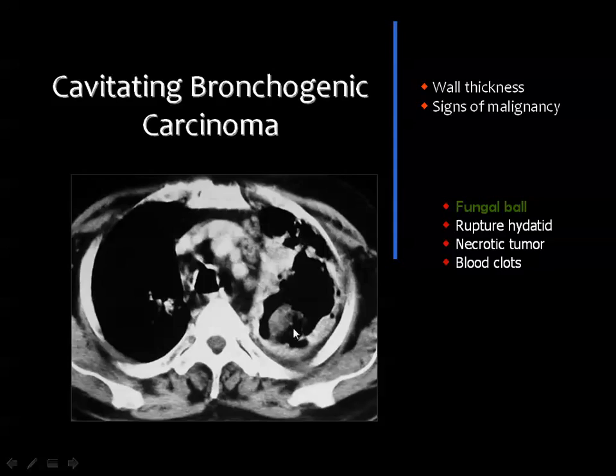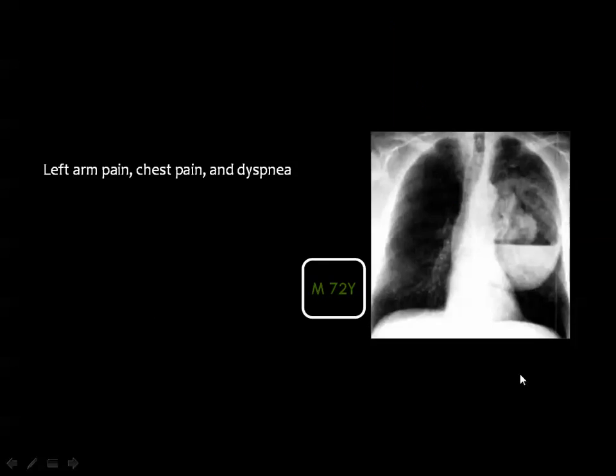Then inside the cavity there may be only air or maybe a mass representing the shreds of the tumor before being expectorated by the patient. Then the presence of a ball inside this cavity, which has a thick margin and irregular inner wall, should be considered as malignant.